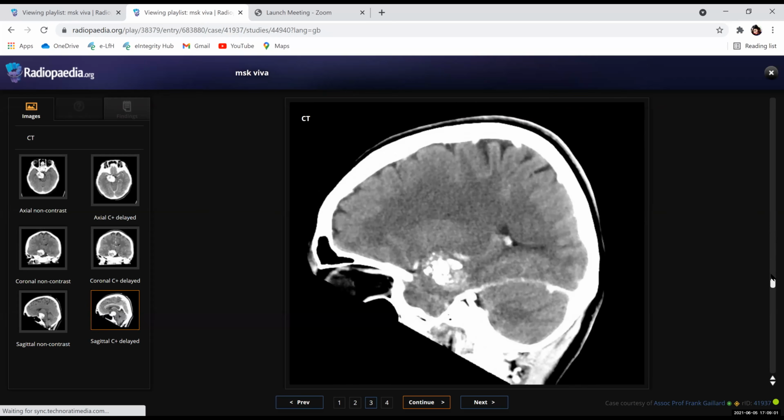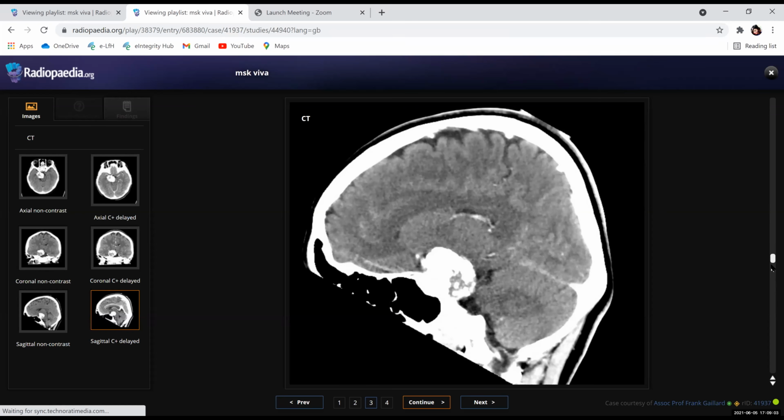Chordoma usually arises from the clivus, and it's central. This is not central. Chondrosarcoma always arises on the side; usually it's not central. But this is 25 years, chondrosarcoma is not the age group of 25 years. I don't know. But this was the chondrosarcoma. It's biopsy proven, and it's usually on the side.